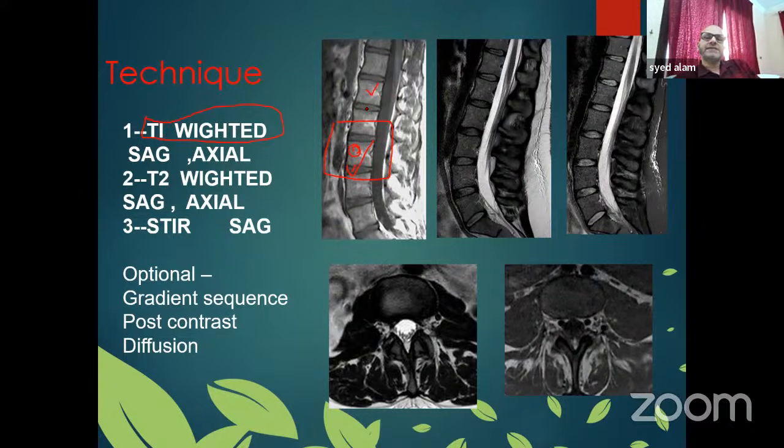If the disc has some degeneration or problem, we can also see it by the paraspinal muscles. So this is my rule number one. If you take one message from my lecture, from the first slide, it is this: the vertebral body in T1 is brighter than the disc. I will repeat this later because I like it, and I will tell you its importance.